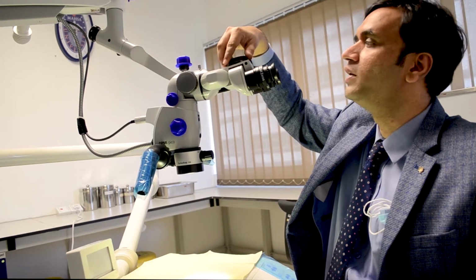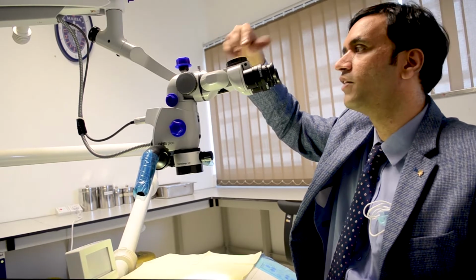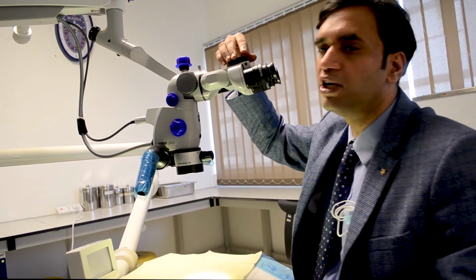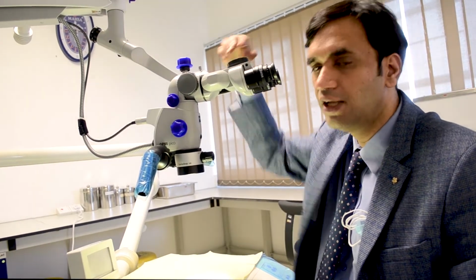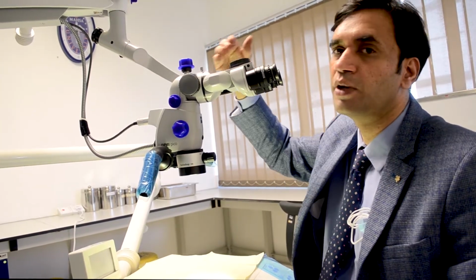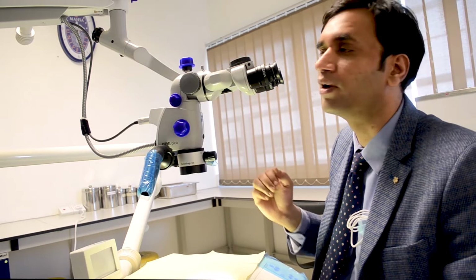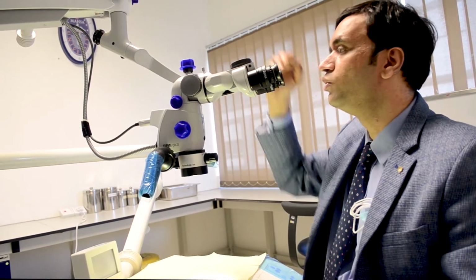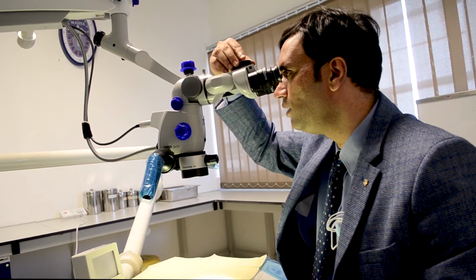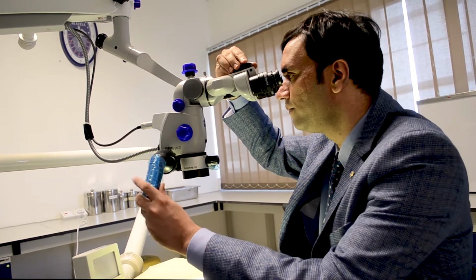What you do normally is you go to the largest value provided on this particular microscope, for example in this case maybe 80, and you place yourself in. If you know your interpupillary distance, no problem, but if you are using it for the first time and do not know your interpupillary distance, this is what you can do. Normally I know my interpupillary distance, so I just set it at 60, but for first-time users who probably don't know their interpupillary distance, this is what I would recommend. You go there, you try to move, you place yourself in there. First you will start watching the image with one eye. You will have two circles as we move, something like that.